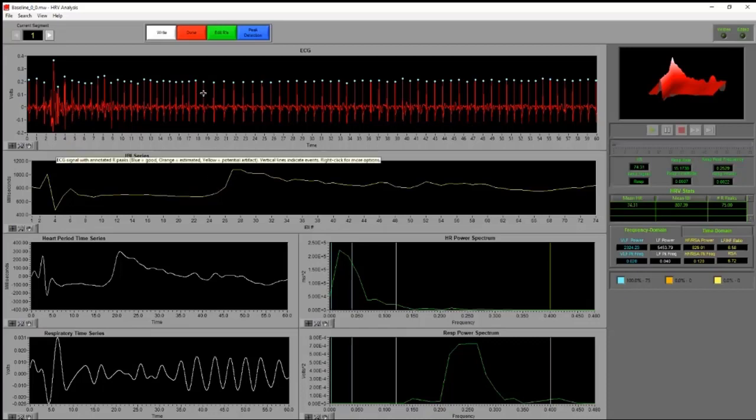This is certainly just the timing slowing down. We can even visually see that the beats right here are a little bit shorter in time in between them. And then all of a sudden this slows down. And we'll talk about that in just a second, why that's happening. But that's noteworthy for sure. So both of these locations would be great areas to zoom in and pay special attention to.